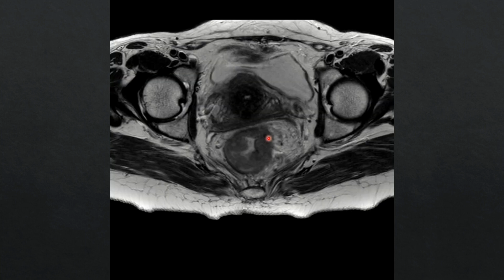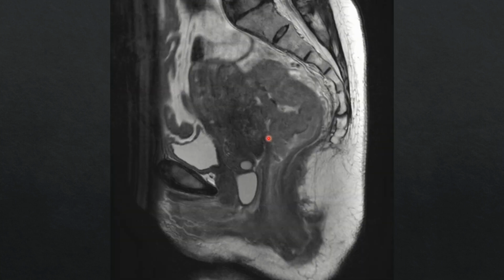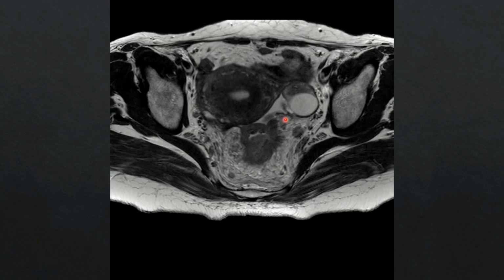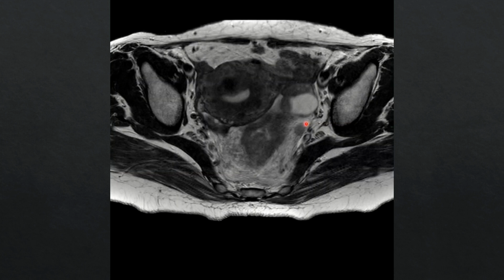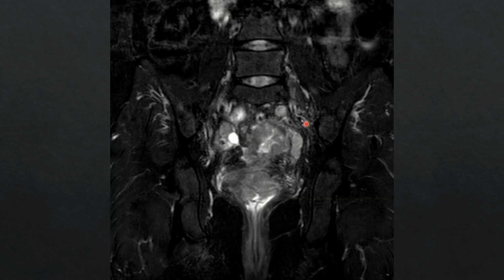So this patient will be posted first for neoadjuvant CTRT, then that will downstage, and again upfront surgery can be planned. Coming to a more advanced disease, a large polypoidal growth tumor involving the middle and lower rectum. Here we can see there is involvement of the anterior peritoneal reflection, and multiple nodes are seen. So irrespective of the N staging, it will be labeled as T4 disease, as it involves the anterior peritoneal reflection.